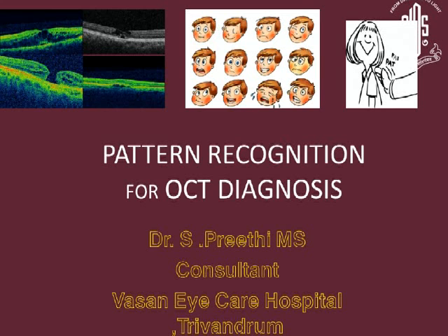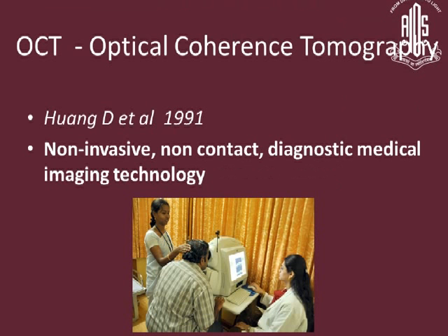I'm going to quickly go through the basics of OCT imaging, the difference between the time domain and spectral domain OCT, the spectral domain OCT macula of a healthy eye, and the various patterns to be recognized in OCT and its influence on management in various pathologies.